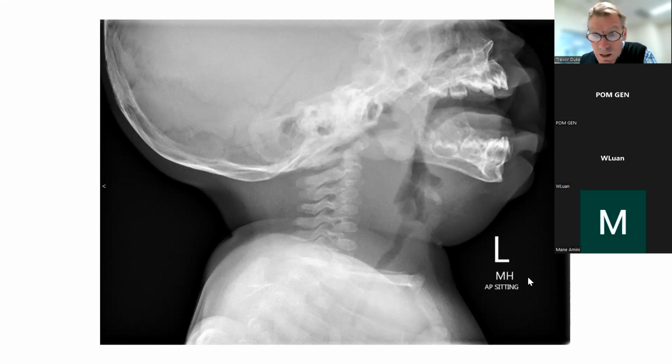Soft tissue swelling. Very good, Wilma, very good, yeah. And where's the soft tissue swelling? Just under the jaw, the mandible. Yep. That's right. There's a large soft tissue swelling here. But the clinical sign I wanted you to look at is this.